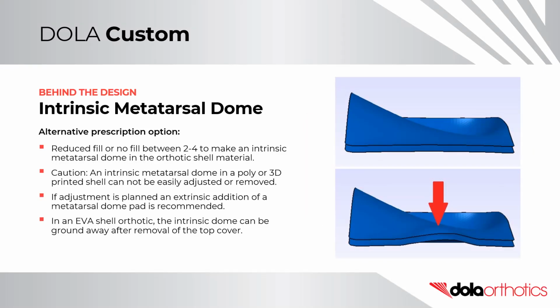Behind the design, intrinsic metatarsal dome. This is an alternative prescription option, which involves the reduced fill or no fill between metatarsals 2 to 4 on your positive cast or in your CAD design. This will make an intrinsic metatarsal dome in the orthotic shell material.